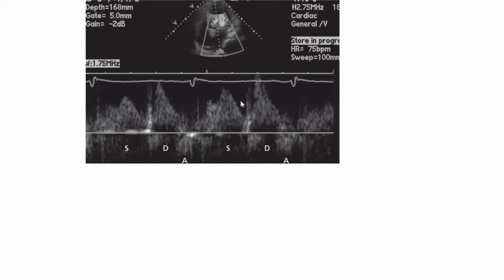And this is an image of a pulmonary vein flow. It's difficult to acquire the pulmonary vein flow. It takes extra skills. In order to obtain it, it's typically obtained in a 4-chamber view, typically the right pulmonary veins, either the right upper or right lower pulmonary vein. You need to have an unzoomed view, a very well opened LA, even if you have to foreshorten the LV, and you tilt the probe either anteriorly or inferiorly.